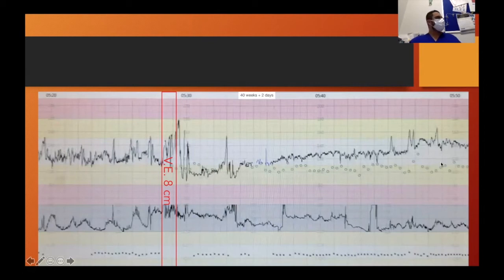Yeah. So she does have an epidural top-up, so has she dropped her blood pressure? Could mum have had an episode of hypotension? Is she on her back? Is that precipitated from the cord or something? The baby's having a bit of cord compression, so I'd probably turn her onto her side, change position. But it looks like it recovers. So that'd be my first thoughts. What's mum's blood pressure doing, and is baby just not happy with mum lying on her back, if she's just been examined? Okay, so yes, both of these are yes.